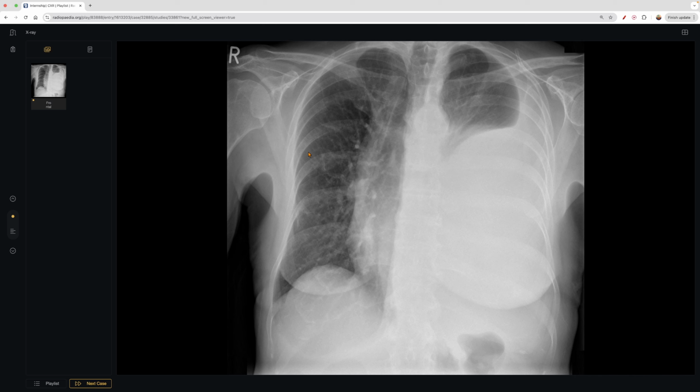And then we come back up here, go across, and you can see the patient somewhat distorted towards their right as well. But what's really important to note here is that you see this trachea coming straight down, and this is that carina. Remember that area where it diverges to the right mainstem bronchus and the left mainstem bronchus? This is also another clue because this pleural effusion is so big that it's pushing away the anatomy. It has a mass effect, positive mass effect. It's pushing versus a negative mass effect. It's withdrawing, which is typically found in atelectasis. And you can see the lung here is a little bit more crowded, right? That's just from all that mass effect as well and shifting.